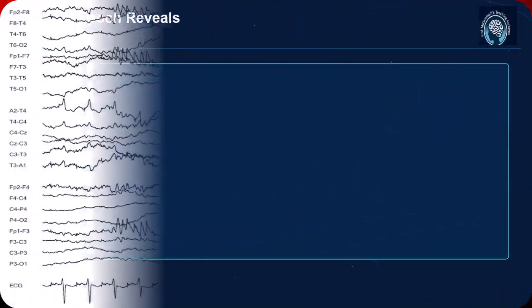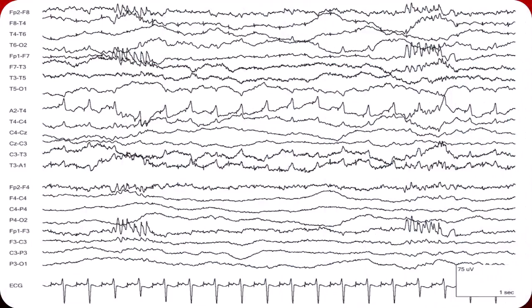This example shows a contoured bilateral frontal repetition at a fixed interval. The source is a circulatory pump, and pulse artifact is also visible in multiple channels. At first glance, the sharp contours may draw attention, but the regularity in relationship to a mechanical device are the important interpretive clues. This reinforces a central principle. Artifact recognition depends not only on waveform shape, but also on timing, distribution, and knowledge of the patient's surrounding equipment.